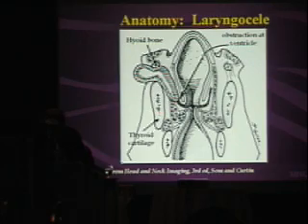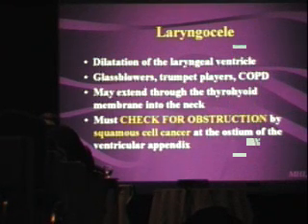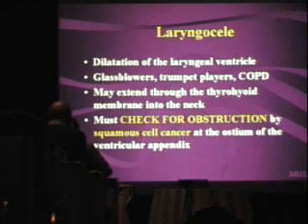You should always check to make sure there's not a cancer there, but 95% of the time there isn't. This is especially seen in people that have high intraoral pressure: glass blowers, trumpet players, people with COPD. Rumor had it at one point Monica Lewinsky had one of these. Always, though, check for obstruction. Look for the squamous cell cancer.